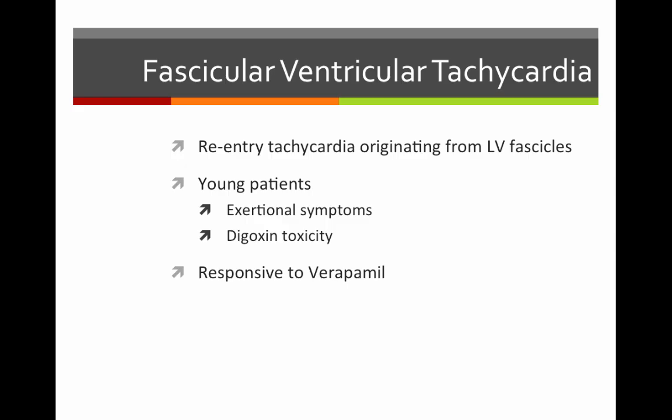We can also see these in digoxin toxicities. So remember that dig dip that we've talked about before doesn't necessarily indicate a digoxin toxicity. This is one of those things that does indicate digoxin toxicity. For our patients here, they will be responsive to calcium channel blockers, especially verapamil.